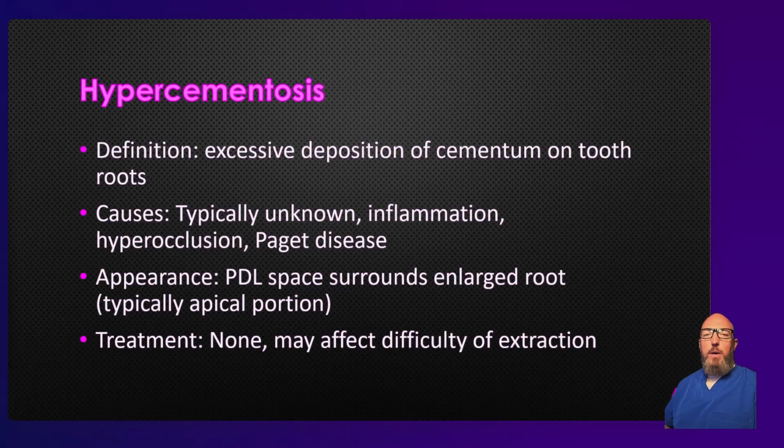And so again, you probably want to vitality test these teeth and rule out an inflammatory lesion. There's no treatment for these, but if you do need to extract one of these teeth, keep in mind now you're kind of extracting a tooth with a root that's like a ball in a socket.